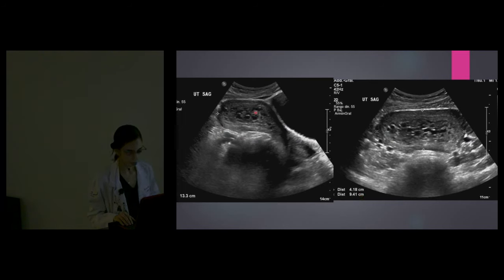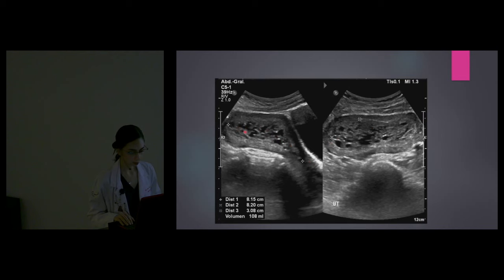The sagittal and cross images from a grayscale ultrasound show an enlarged uterus with multiple anechoic spaces within it, and an echogenic intrauterine mass that corresponds with an enlarged placenta with multiple cysts of varying shapes and sizes. There was no embryo or fetus within it.